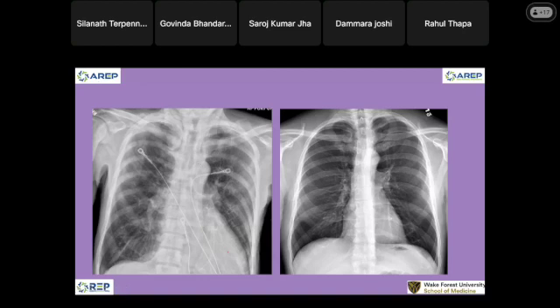What's systemic? It's metabolic disease like renal failure, a chronic renal disease, and hyperparathyroidism, when the calcium in the blood is a lot. That's chronic renal disease, which can have diffuse sclerosis. This one I have no idea where the mass is coming from. When the mass is big, we have no idea where it's coming from. When the mass is medium in size, that's the best time to tell where the mass can come from. And one more thing you think about.